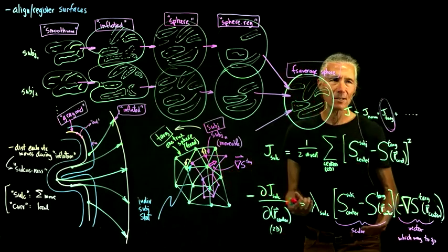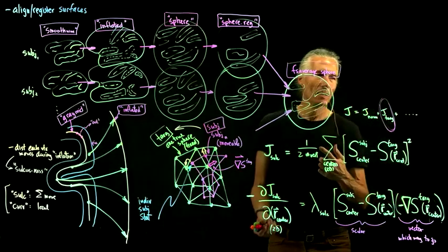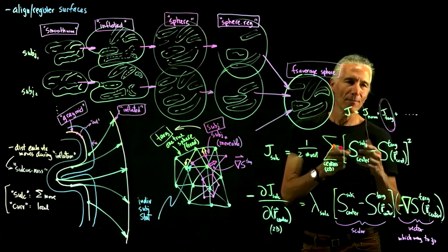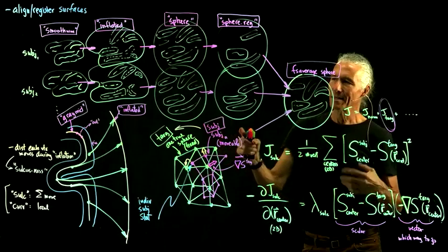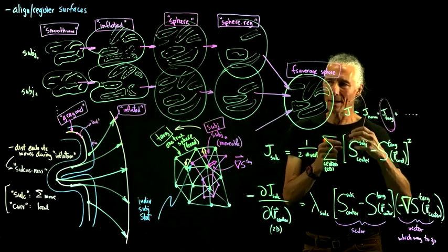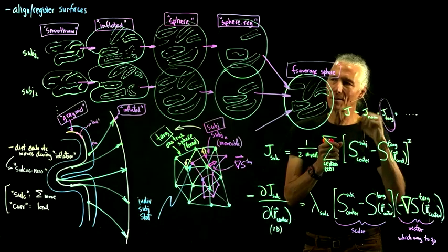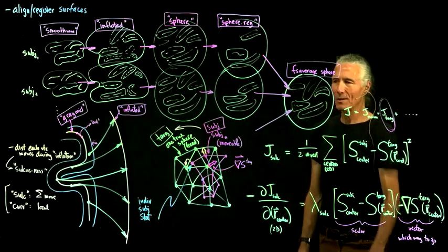If the target is changing very rapidly, you won't have to go very far to get to a higher sulcusness. Say we're looking for a higher sulcusness, and the gradient in the target is very big. That means a small movement will cause a large change in sulcusness, so you don't have to move as far. Both of these things factor into it.